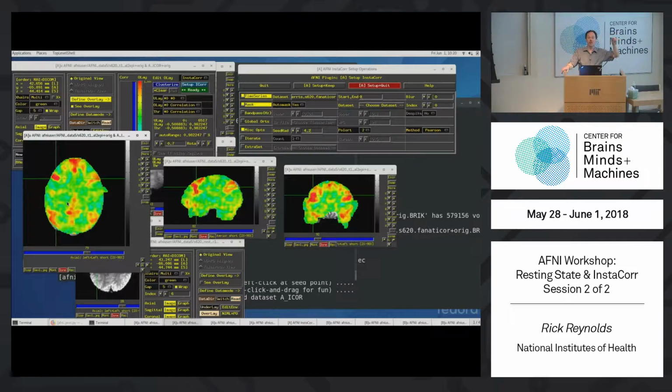What is it doing? Suppose the time series has been set up so that you can just do a dot product for the correlation. So what happens now, at each voxel, you correlate with the seed time series, and you get a map of correlations. Those are converted to z-scores. Those are normalized z-scores. You can do your t-test on those normalized z-scores.